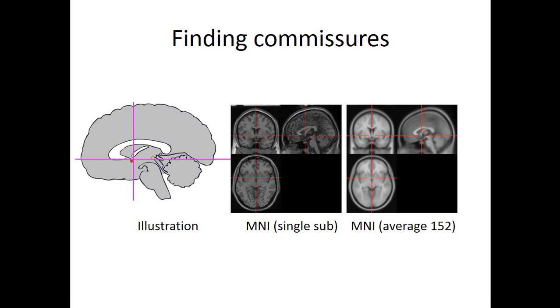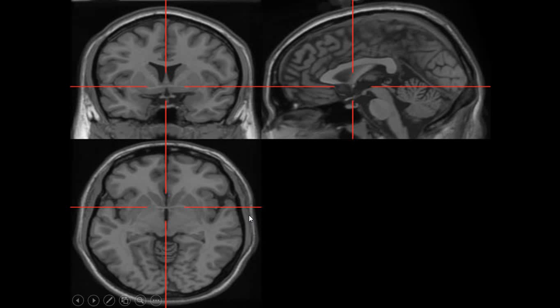Okay, so the images are basically aligned to each other. So this is the anterior commissure. It's this position here. And we basically want that to be pointing to this point here. Now, I think on the next slide I have a zoomed in version of it. So the anterior commissure is this location here. It's this little bridge here on the axial view. In the coronal view, it's this point in the middle, and there's a kind of a little mustache across here you can see, hopefully. That's here at the end of the fornix. Okay? So that coordinate there is the anterior commissure.